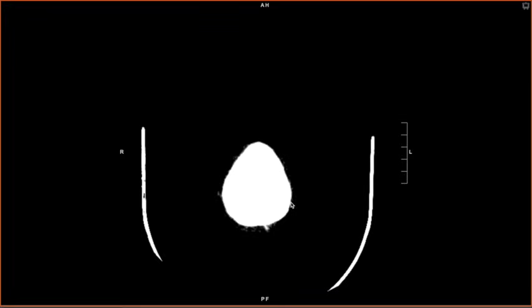Let's go through a CT scan and demonstrate our conceptual approach that we just learned. And then we will practice our simplified conceptual approach on a few illustrative cases. Okay, so I stress that this is a conceptual approach. It's very simplified. And if you're going into radiology, your approach is going to be more detailed, and we'll talk about that approach in a few minutes at the end of the talk.